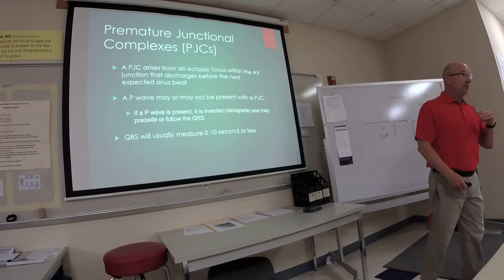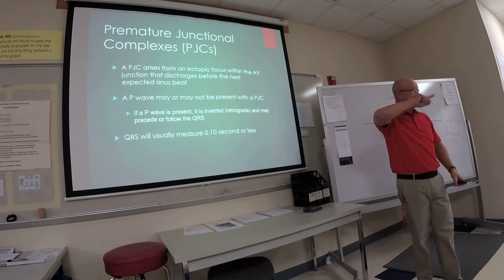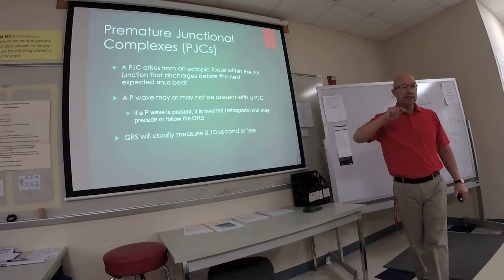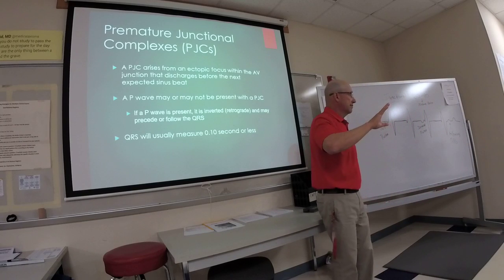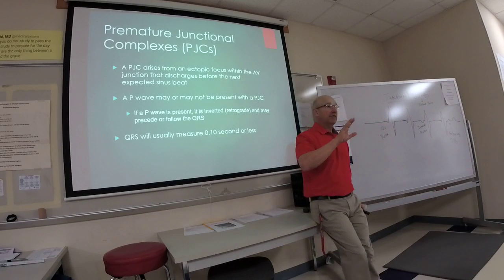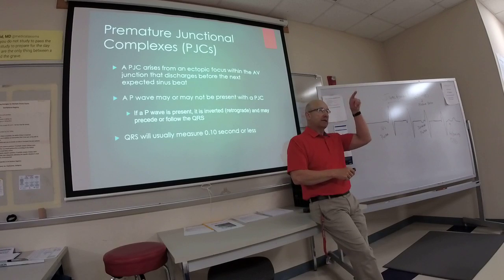Remember it's atrial because of the P wave. For some reason, one of those atrial cells contracted.